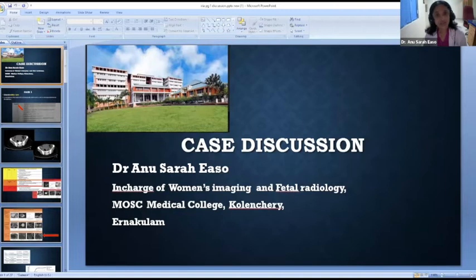Now, O-RADS 4 will have an intermediate risk, and here the lesion will have still lesser enhancement than the myometrium, but it will be an intermediate risk curve, and there will be solid nodular enhancement in the lesion.